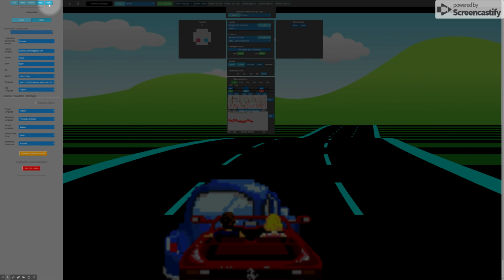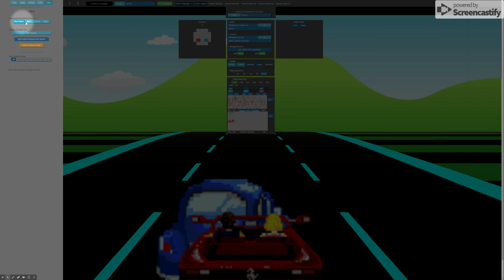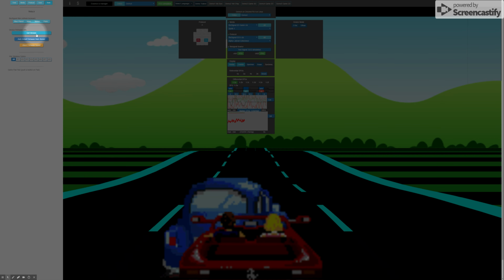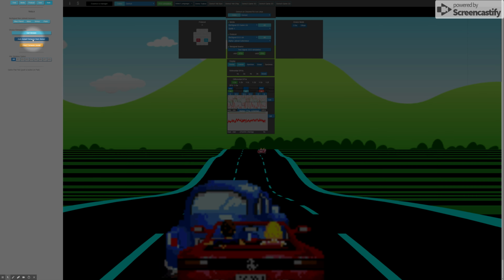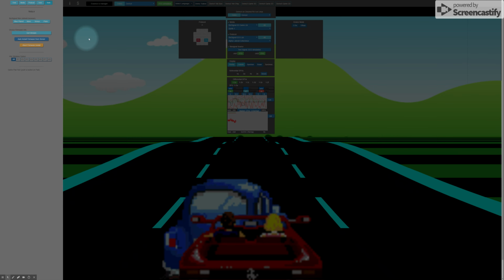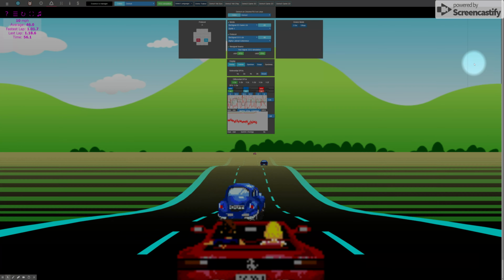And then finally, under Tools, you can change the skin if you don't like the color scheme. And you can also update firmware on your hardware, on your BioSignal acquisition device. Okay, so that ends the introduction to biosignal.network.